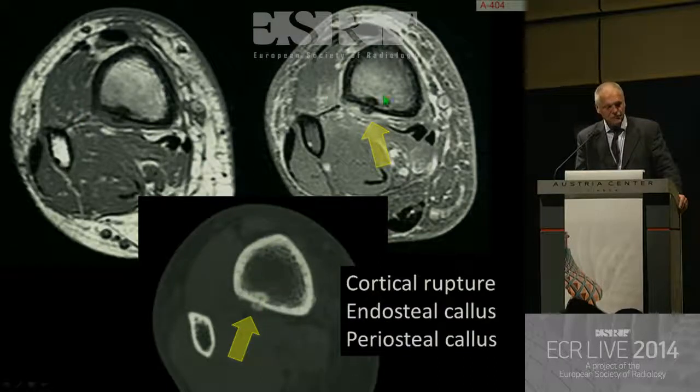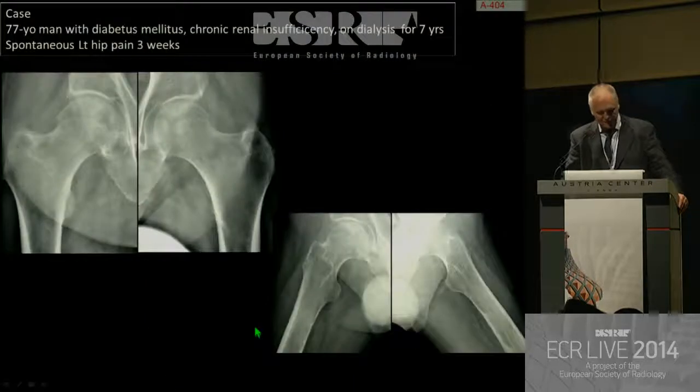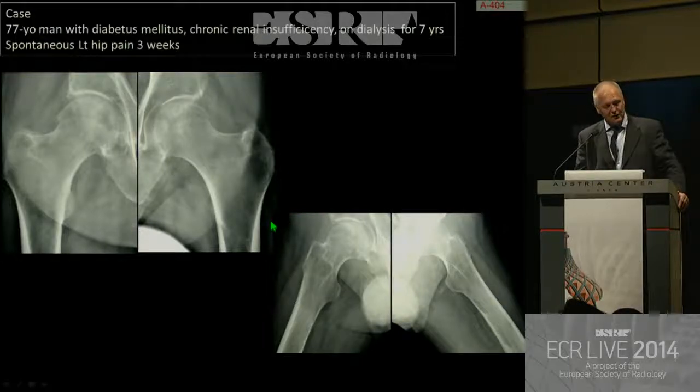Look at the corresponding MR. You must be very good to make the diagnosis on T1 or on T2 if you are not aware of the condition. So never hesitate, if you are facing a bone condition, to add a CT to look for the diagnosis. These fractures are important to recognize, and unfortunately, they are becoming more and more frequent.